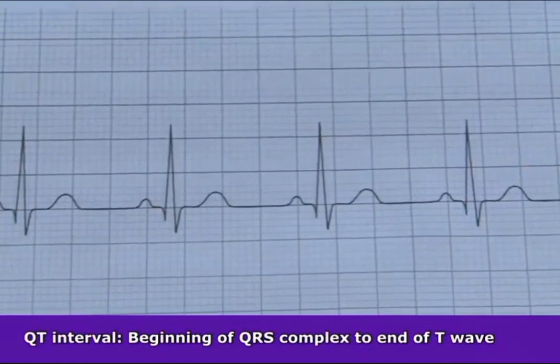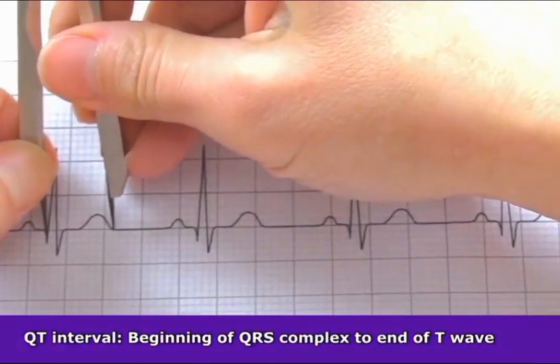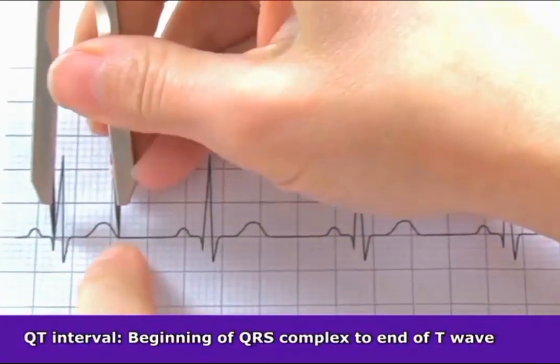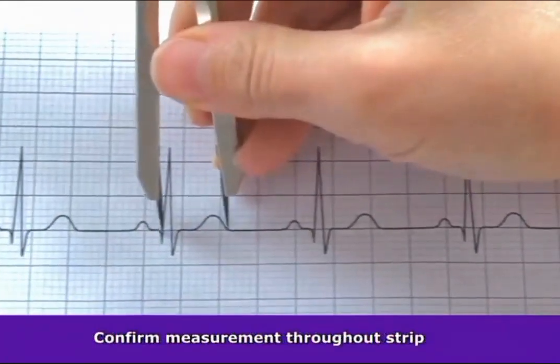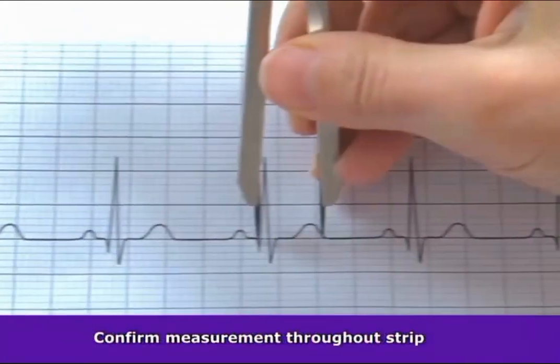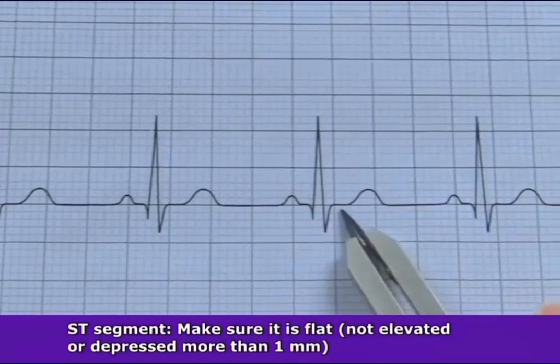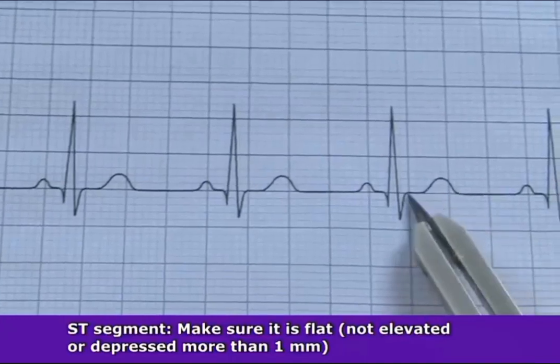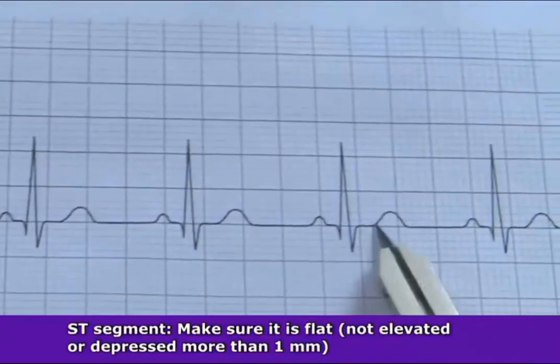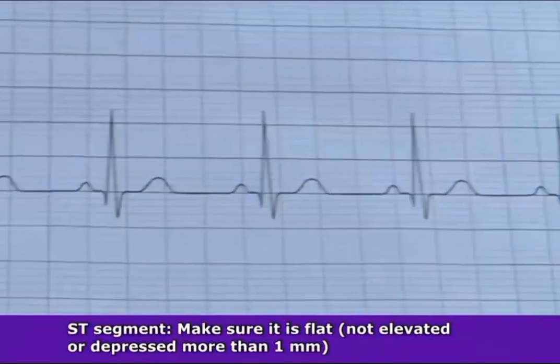Then you want to take a look at the QT interval, and again, that was found at the beginning of the QRS complex to the end of the T wave, and you just want to count the boxes from there to there. Here we have about 9 boxes, so that gives us 0.36 seconds. And just track that down all throughout the strip and just confirm you have that throughout. And then lastly, we just want to look at the ST segment and make sure that the ST segment, which again is found at the end of the QRS complex to the beginning of the T wave, is flat, not elevated or depressed more than 1 millimeter, and here that is not.